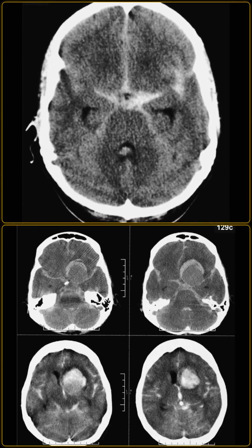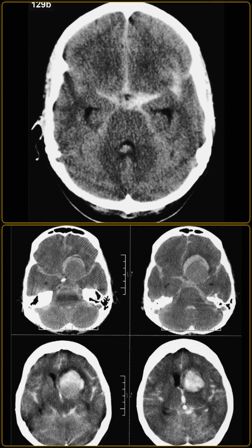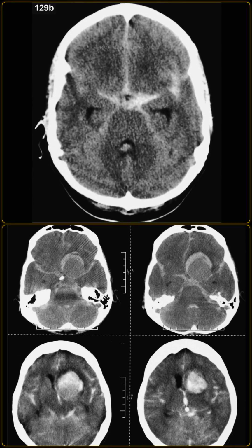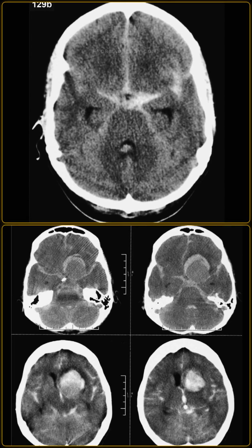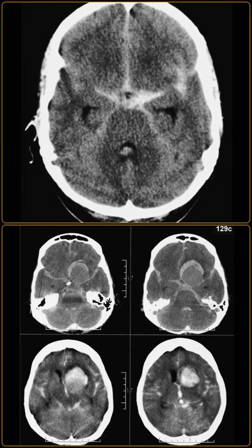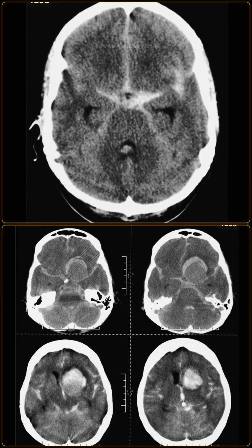I am showing you axial brain CT scans of two comparison cases showing subarachnoid hemorrhage. Describe their findings and distinguish them from the index case. Okay. The first comparison CT scan demonstrates an acute subarachnoid hemorrhage, showing high-density blood filling the suprasellar and basal cisterns. This is accompanied by dilatation of the temporal horns of the lateral ventricles, indicating early obstructive hydrocephalus.